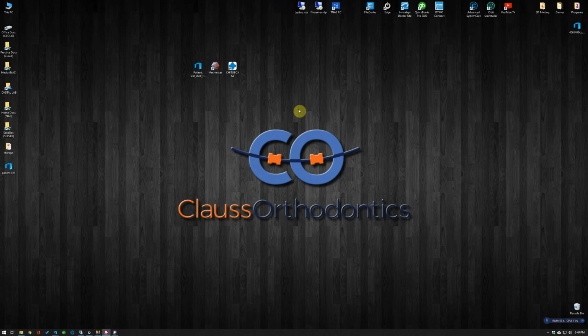This is Dr. Mark Claus, and I'm just going to run you through really quick how in my office I use Meshmixer to base and label my models in order to get them ready for 3D printing. By no means am I an expert in this. I just happen to dabble in it.